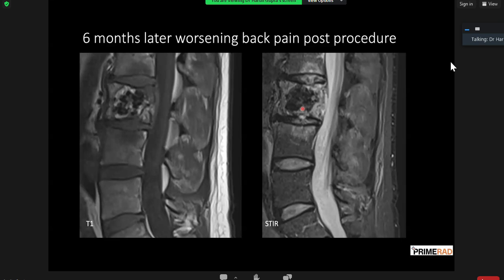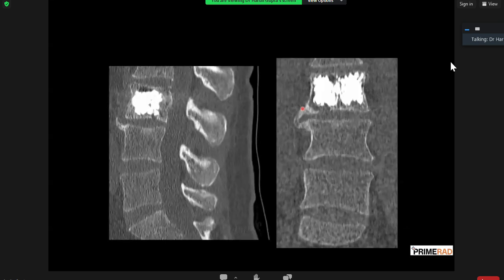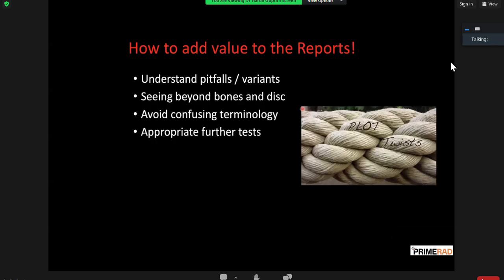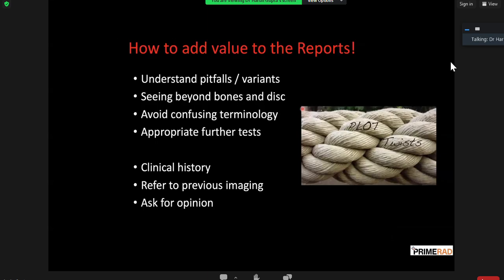We change the diagnosis, and then the management becomes management of seronegative spondyloarthropathy and not infection. As I already said, we saw a lot of cases where the radiologist twists the plot, which can be very, very useful in patient imaging management.